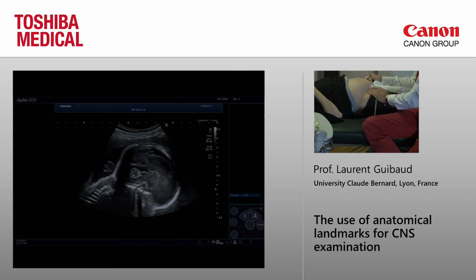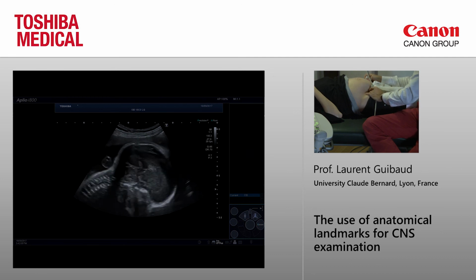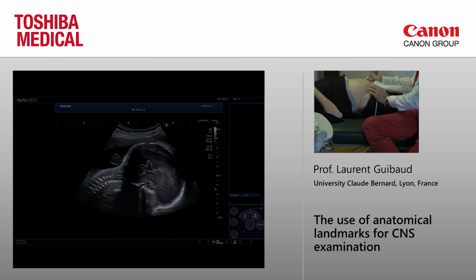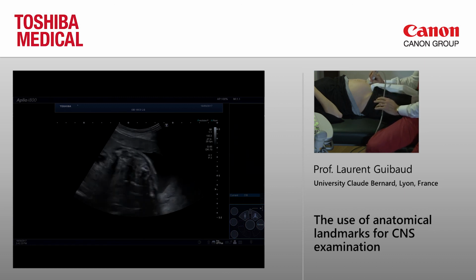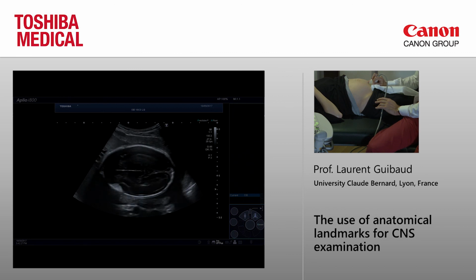If you go at 26 from one side to the other, and there is no echogenicity of the vermis, and the TCD is a little bit decreased, what's your diagnosis? You go from one side, hypoechoic, no echogenicity in the middle, and the TCD is a little bit decreased. Yes, rhombencephalosynapsis, yes. You are very clever.